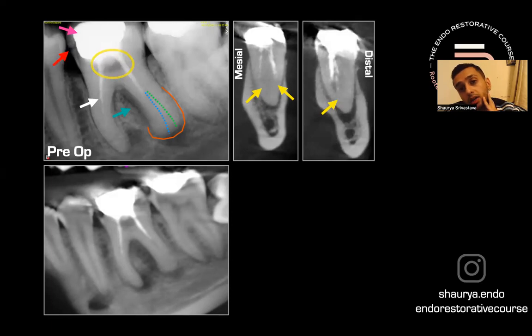Now, when I look at that distal there, there is something that I am dreading, which is one canal outline here, a second radiopacity, a second canal going here, and there is a third one in a different direction here. So there is some sort of a trifurcation in this distal canal, and they're calcified.